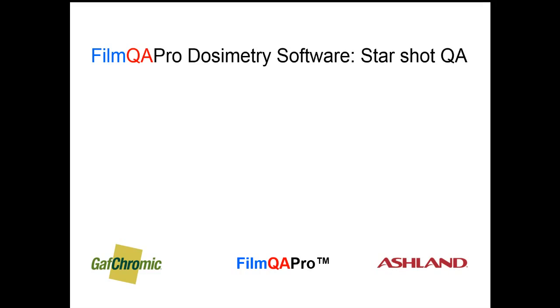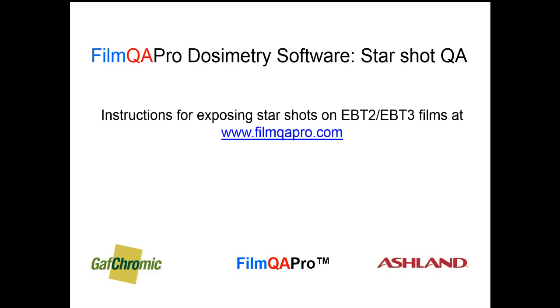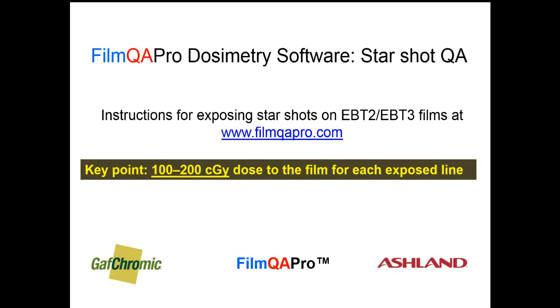This module describes the use of FilmQA Pro to analyze a starshot image, and a protocol for recording gantry, collimator, and couch starshots on radiochromic film is available on the filmqapro.com website. An important point in creating a starshot image on radiochromic film is to use a dose to the film of 100 to 200 centigray for each exposed line.